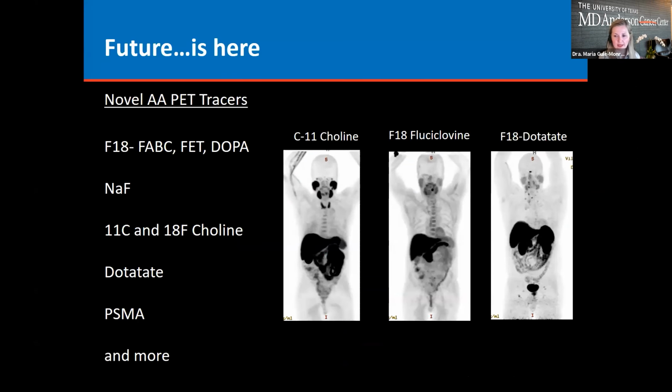The use of amino acid PET imaging has demonstrated significant promise in brain tumor imaging. Amino acid PET imaging has been shown to be more accurate in identifying infiltrated regions of tumor, extending beyond the areas of contrast enhancement, and better distinguishing tumor versus non-tumoral edema and normal brain. In addition, amino acid PET provides functional and metabolic information about the tumor and may identify tumor regions with different biological and clinical behavior.